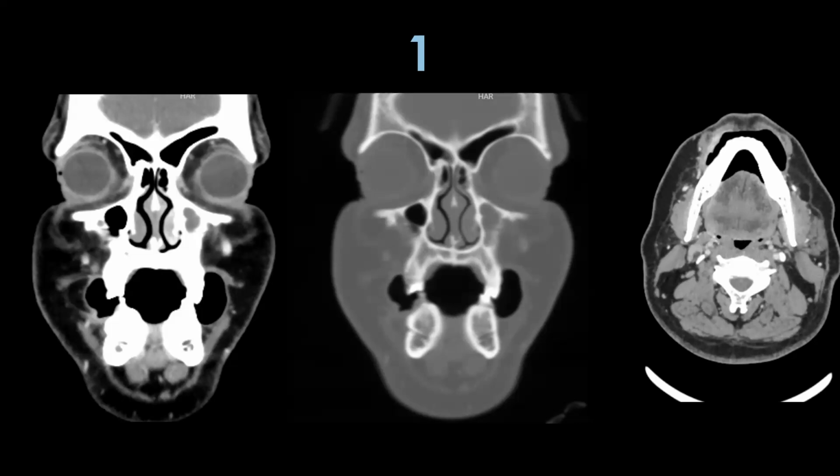So this is a straightforward case. Puff cheek technique, soft tissue window, bone window, and axial imaging. Asymmetry along the right buccal mucosa extending into the inferior GBS. No bony erosion. On axial, I can see buccal mucosa buccinator complex involved. So this is early buccal mucosa cancer.